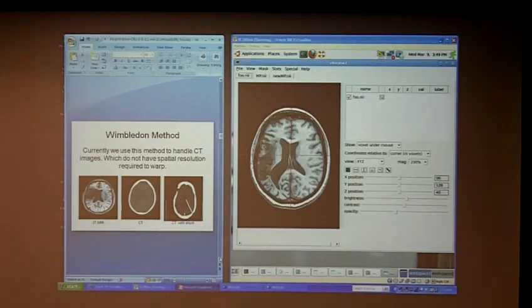And this is just to give you a sense of the difference in image quality between some of our 3T scans and our CT images. As with most of our CT subjects, they usually have some health precaution that prevents them from getting an MRI scan. And in this case, this person has a shunt, which clearly is sucking up half of the scan, as you can see.